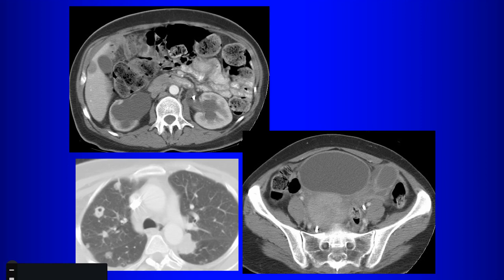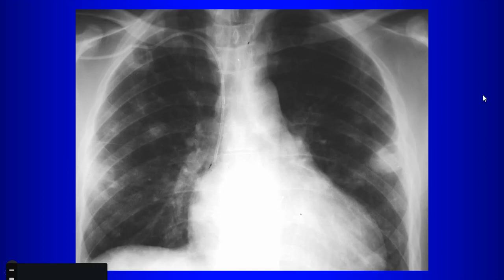Cervical cancer. Cancer of the cervix. Yeah, advanced cancer of the cervix. That's squamous cells. So that's why you have advanced cancer, and that is associated with hydronephrosis. That can result in hydronephrosis, pelvic masses, in this case, the metastatic disease to the lungs, which are cavitary. So squamous cell metastases can also give you cavitary lesions in the lungs.